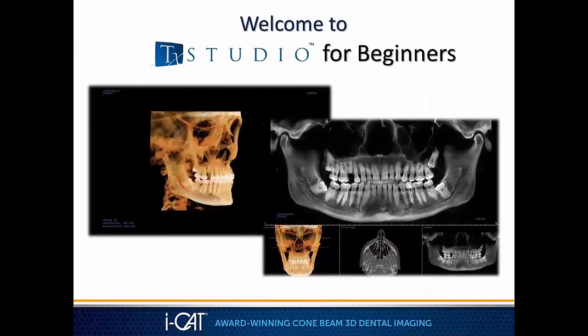I'd like to welcome you to this tutorial on the basic functions of Treatment Studio. Treatment Studio software is created exclusively for iCat systems and provides tools for implants, abutment placements, restorations, surgical procedures, endodontics, orthodontics, TMJ, and airway assessment, all in a single software package.